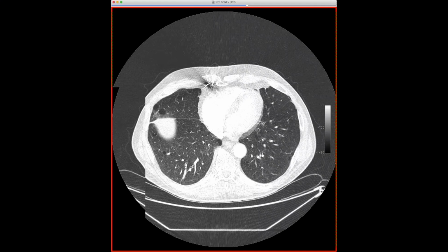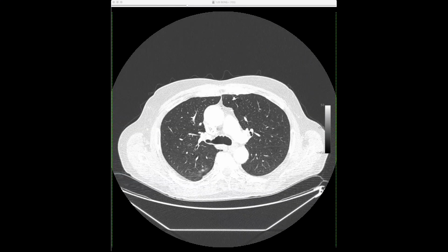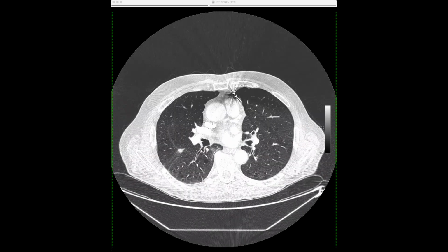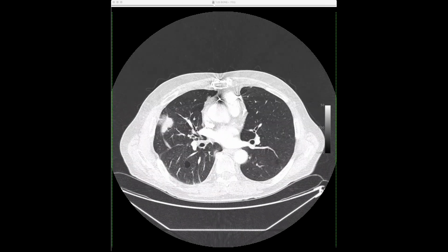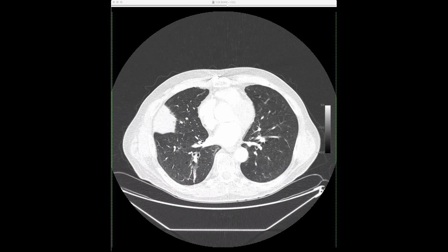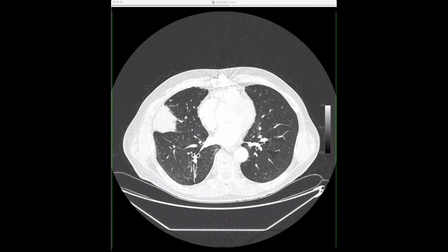But here's the same lesion. You should see 2 CTs now. There it is in 2017, so it is a little bit bigger. But it's been sort of smoldering along and developing a few more sites, more nodules now. So this is an indolent maltoma. Also has been biopsied. Now I think they're being treated with rituximab or something like that.